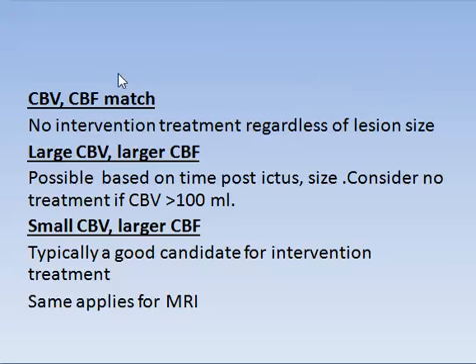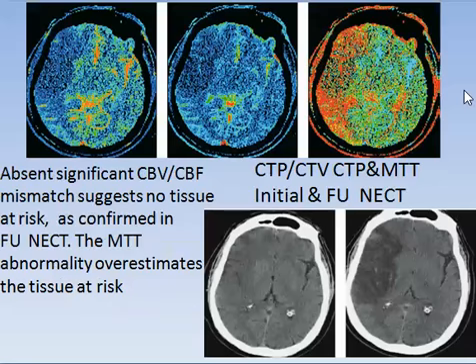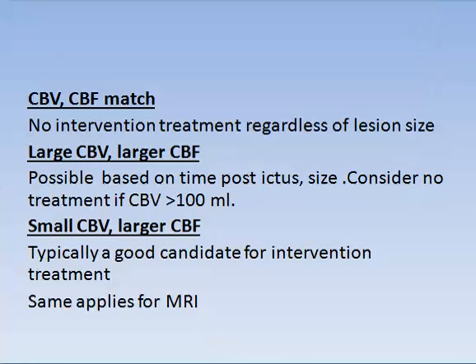Now, if the cerebral blood volume and cerebral blood flow, as in this case, are matching, so there is no intervention, regardless of the lesion size.